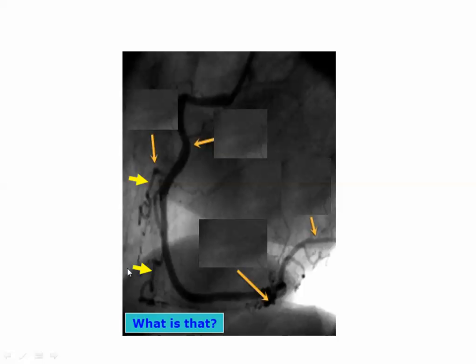So what's this view? Yes, LAO. This is the direction of the ribs. Okay. Yes, diaphragm. It's left cranial. So what are the walls? Septum, anterior, lateral, inferior, the short axis circle. So you will expect that the septum will be here, anterior, lateral, and inferior.